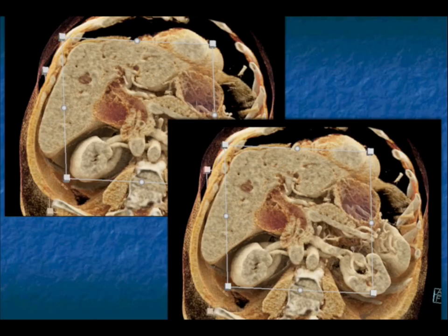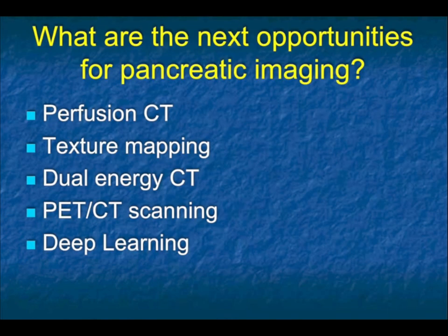The patient had ERCP. They retrieved the stone, removed the stone, and the patient was fine. And again, you can see it nicely on the 3D maps. Common duct, and there's the stone. So it's very important when you see duct dilatation, follow it downward. Use all of your tools to look for the transition point, whether it's nodes or vessels or tumor, whatever is going on.